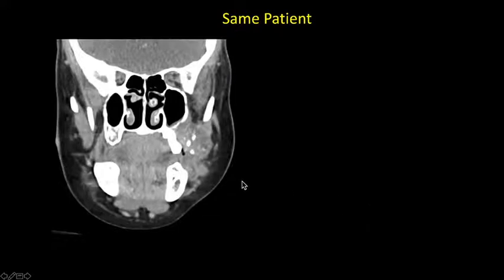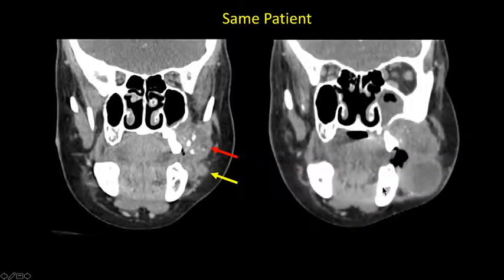And this is that same patient. I've just blown up that coronal image for a second. I want to point something out. So here's the main mass, partially calcified again. And you see this little component down here looks separate. This is probably an enlarged lymph node of the buccal space. And then on follow-up 3 months later, you can see they still look kind of separate, and that node is hugely enlarged and getting necrotic.